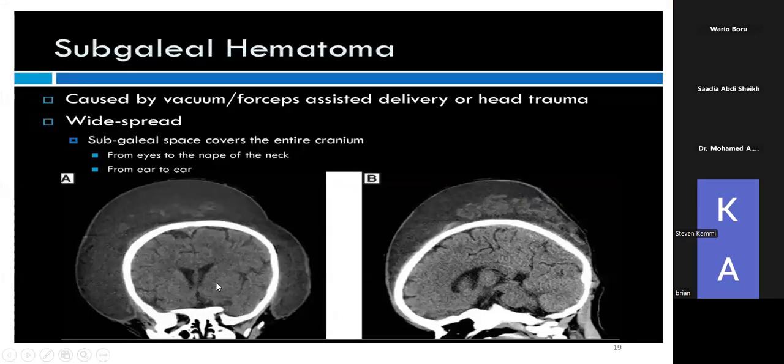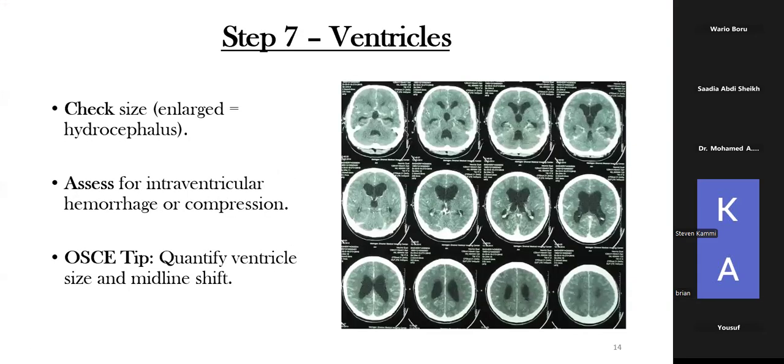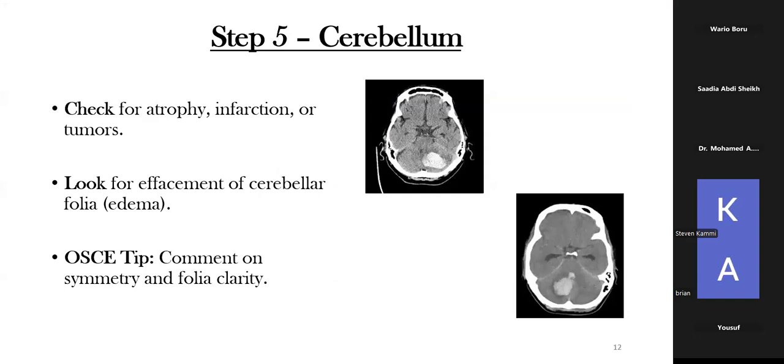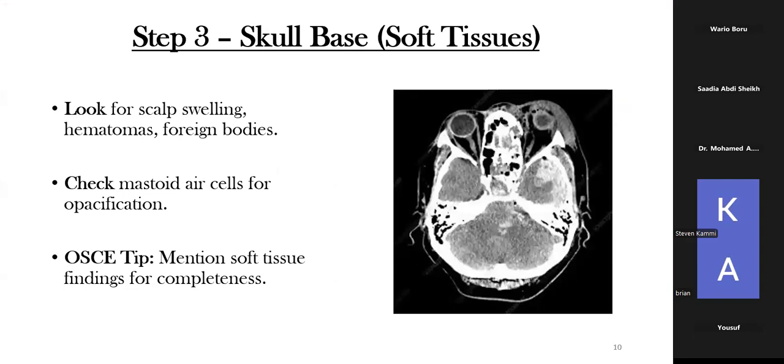So this is an example of soft tissue swelling that you can see at the subgaleal region. But I believe this was a question asked when I was going through the skull base and brainstem. So here, you can see this is a soft tissue swelling. So you can see this eyeball. I hope I'm okay. This is another eyeball. You can see here, soft tissue, how it's normal. But look at here, there's this isodense lesion you can see here.